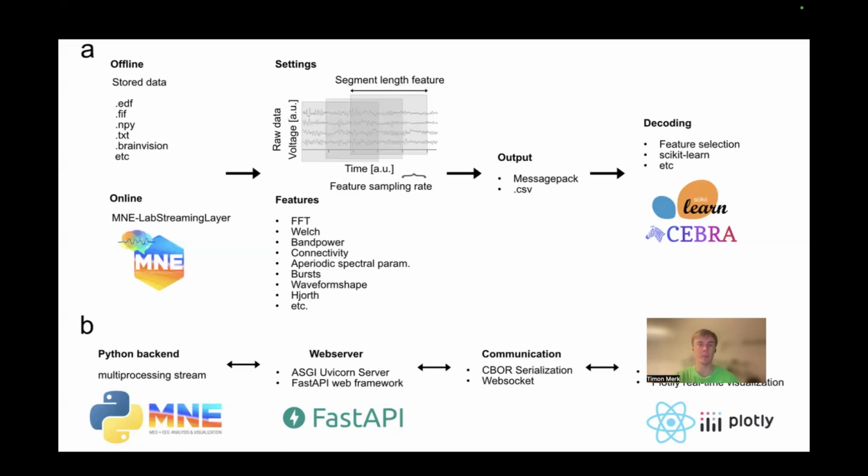The duration for feature computation is specified by the segment length parameter. So, for example, we compute features with a duration of 1 second. The output is then saved in a format called MessagePack. Features are saved iteratively, so that the RAM would not be accumulating too many features. Afterwards, all of the features can be saved in a database, also in a simple human-readable CSV format.